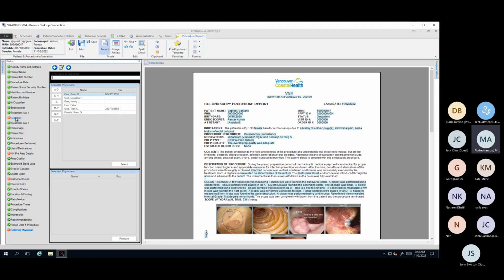Whether you recommend it or not, is it possible to change those parts that aren't in the blue? Can you just erase parts of it? Yes. So the non-recommended answer is anything that's not blue you can modify if you absolutely have to. But anything that's blue you do not want to touch at all. That's not even a recommended answer. That's a flat no.